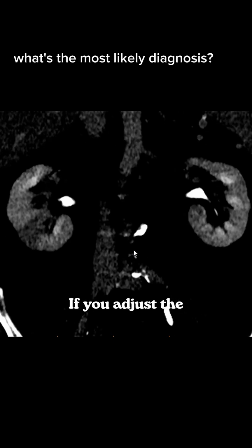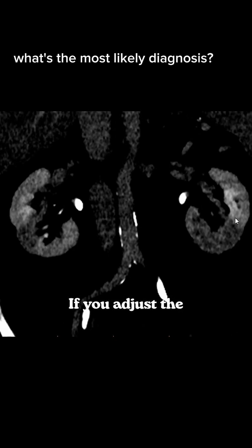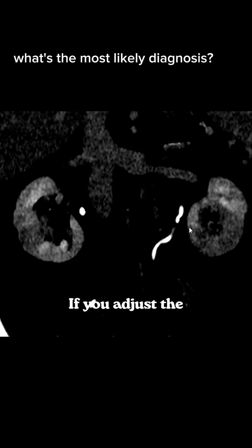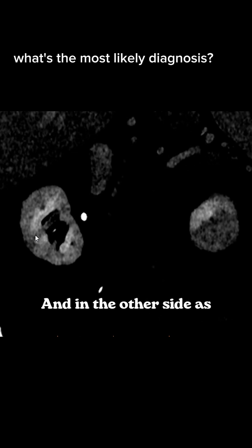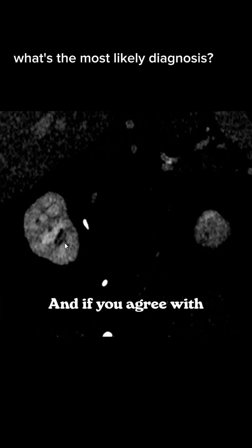If you adjust the window, you'll find there is something different from the normal renal parenchyma here, and in the other side as well. So they are bilateral changes, and if you agree with me that there should be something here.